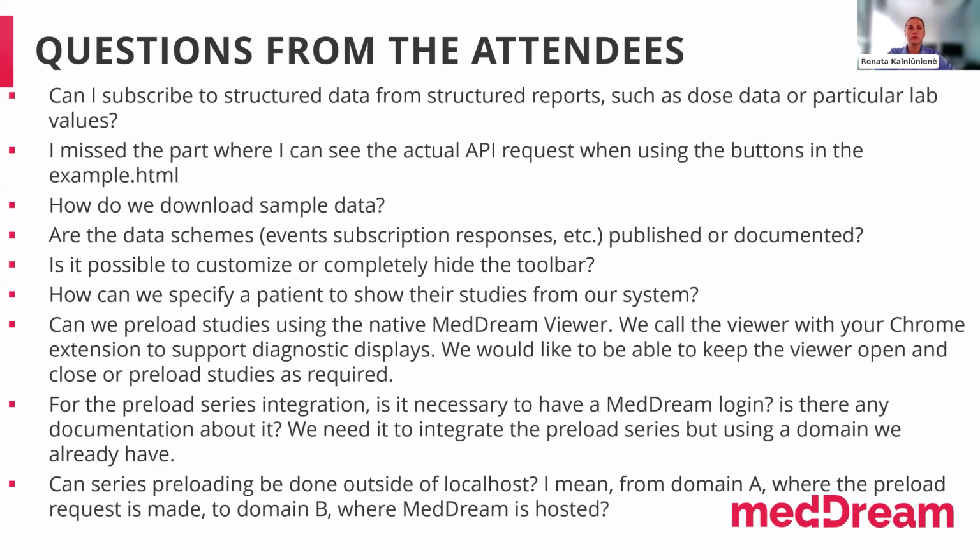Okay, thank you. So the next question, can we preload studies using the native MedDream Viewer? We call the viewer with our Chrome extension to support diagnostic displays. We would like to be able to keep the viewer open and close or preload studies as required.